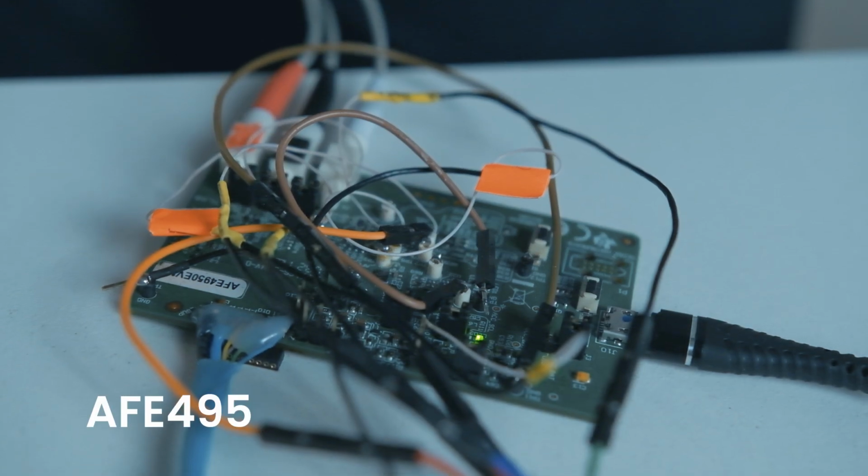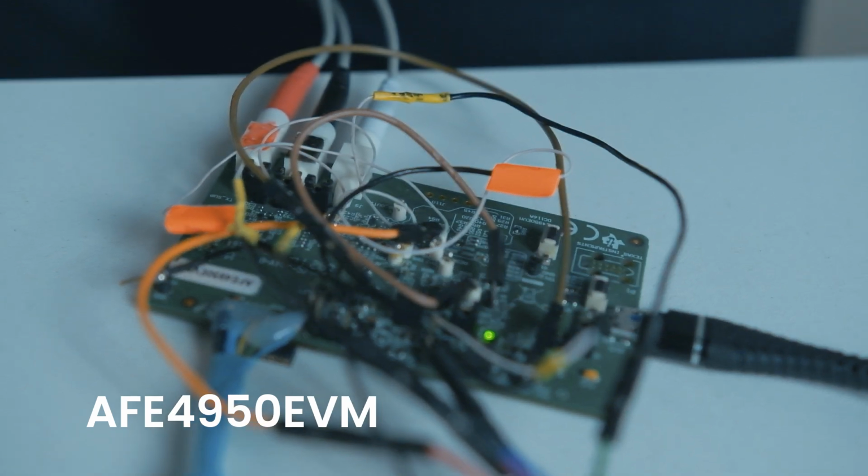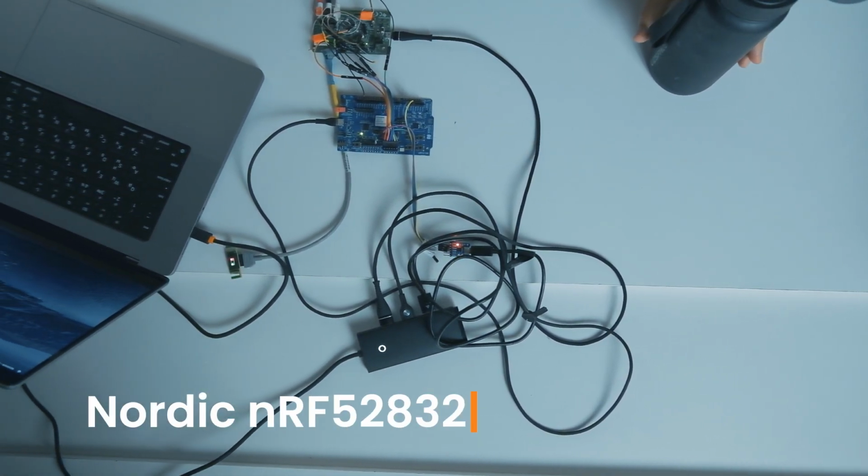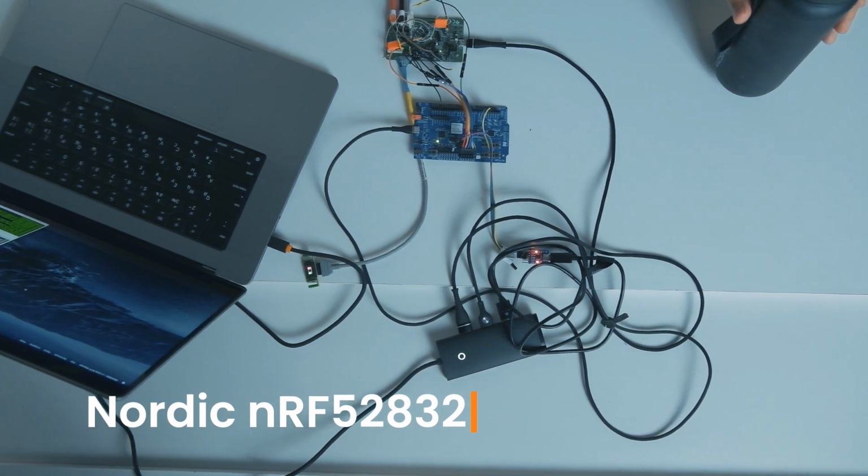In this video, I will guide you through understanding how electrocardiogram sensors work and explore the metrics that can be obtained from these sensors. We will be using the Texas Instruments AFE4950 analog frontend with the Nordic nRF52832 MCU equipped with UART and BLE and a set of electrodes.